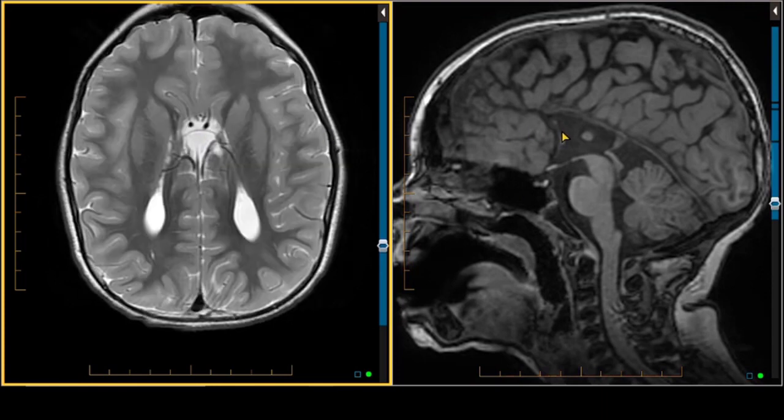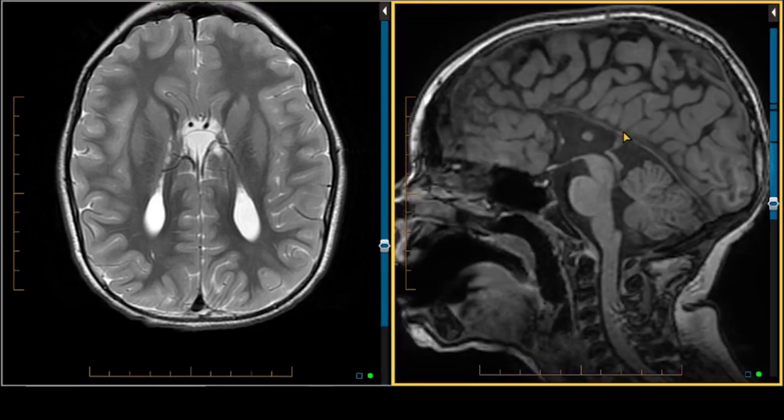If we go to the sagittal T1-weighted image, for the midline structures, we do not see any aspect of the corpus callosum. Additionally, normally just above the corpus callosum is the cingulate gyrus, which runs anterior and posteriorly. Here, we do not see that. We see these radiating gyri that come all the way down to the third ventricle here. We also see here's the anterior commissure, which is a little on the small side, but otherwise we're not seeing any commissural fibers of the corpus callosum.